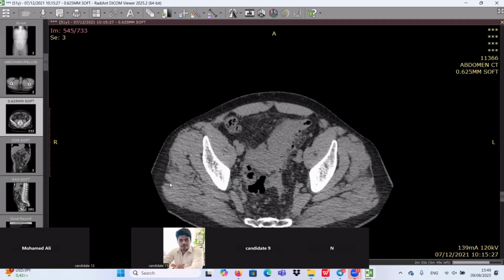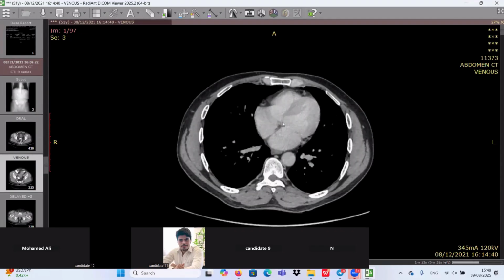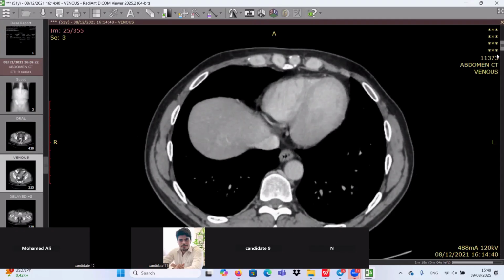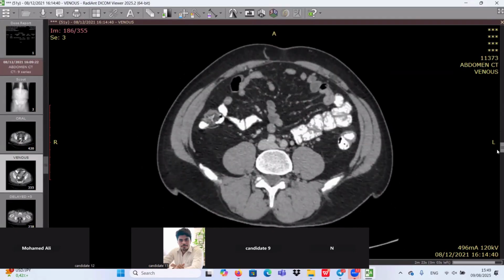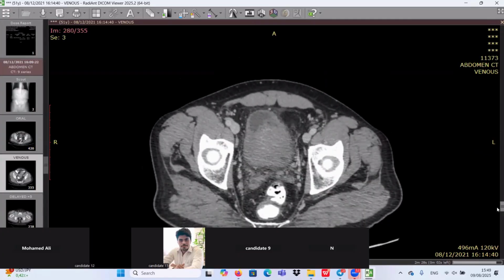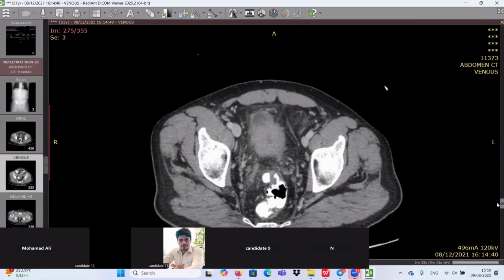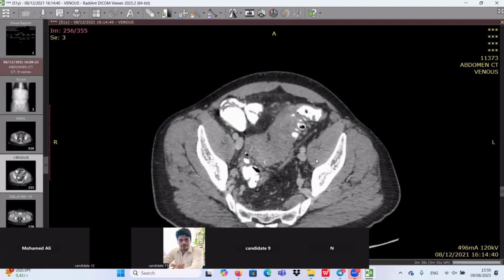Okay. When I saw this one, I requested a CT scan with IV and oral contrast, and this is the venous phase. We did this one the next day. This is a contrast enhanced CT of the abdomen, so both IV and oral contrast. Also, the upper cuts show no significant abnormalities, but the lower cuts within the pelvis confirm the findings seen on the native study.